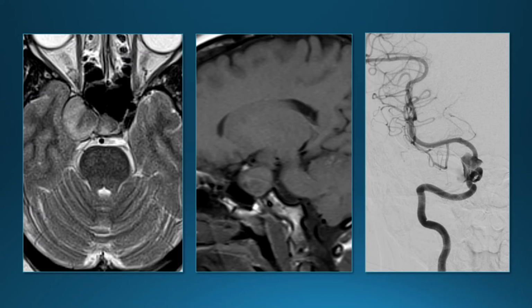Here's another patient with a cavernous aneurysm on the right. Here it's bulging out the cavernous sinus. And it can be tough because this one does not have much of a flow void. You can see the signal in it is kind of funny. It has some darker signal here and then some brighter signal more laterally because there is some flow in it.